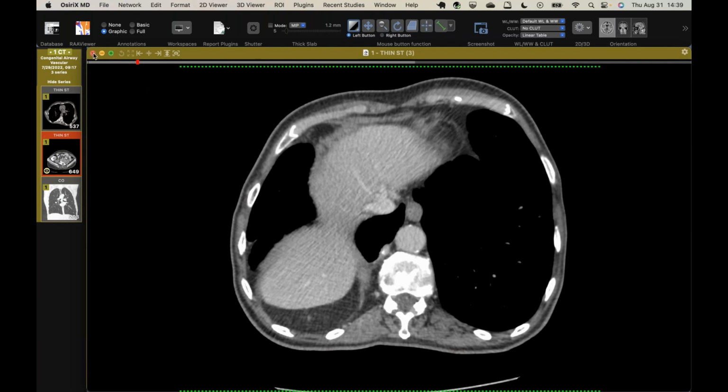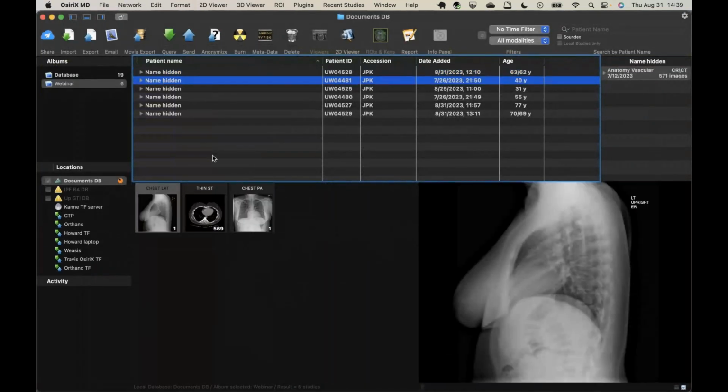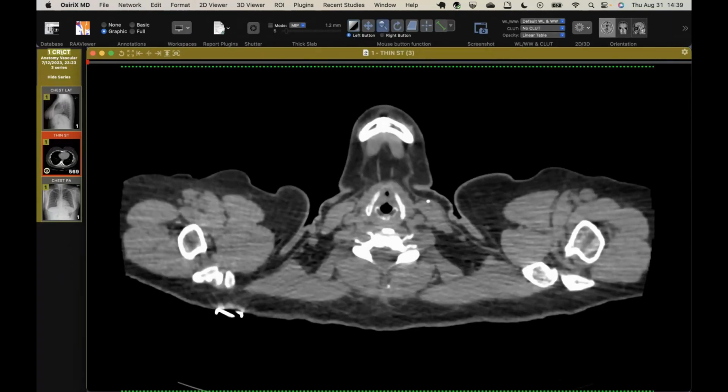Very nice. So even in younger people, you can see that calcification of the systemic artery in cases of sequestration, again because it's getting systemic pressures. Yeah. I don't recall. I've seen it a few times, but I always recall the patients being a little older. But that's good to know. Yeah, it's called premature atherosclerosis of the artery because of that.